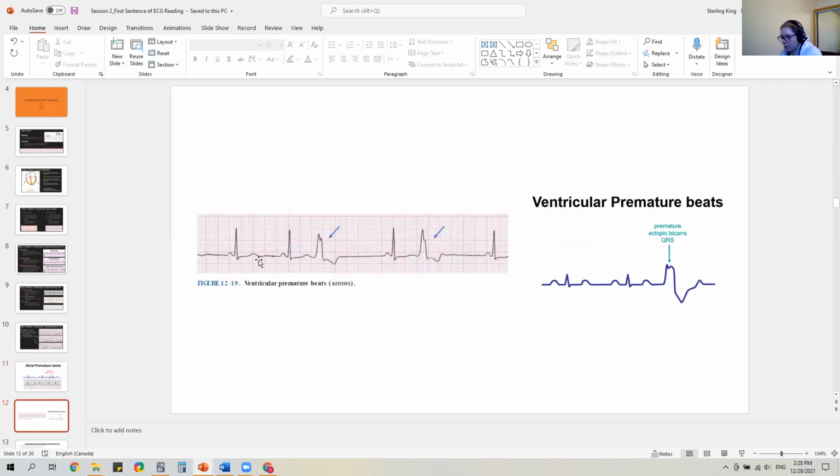Ventricular premature beats are going to look very weird. They go in PQRST, PQRST, and look at this huge P. If that's not, it's probably a T there. And then look at how wide this QRS is. It's a really weird repolarization, so the T is going the opposite direction. And it happens again over here. If it's just a one-off, then we call that a ventricular premature beat. The reason it looks so weird is because instead of going through the Purkinje fibers and bundle of His, it's just going through the muscle, so it's very slow, and it's not traveling on those highways.